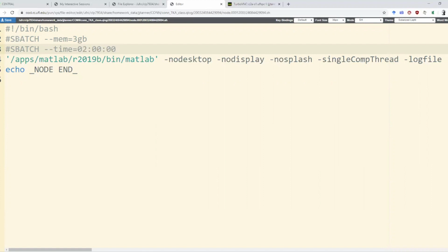020000, and that should be plenty of time. This should only take about 10 minutes per job. It could be half an hour, it could be an hour, but we'll give this 2 hours to run. If you happen to run out of time, then you'd need to go back and edit this and or delete some files and add more time to this. We won't go into that, so hopefully there'll be enough. If you're worried about running out of time, you can give it more time, and that's okay to do.